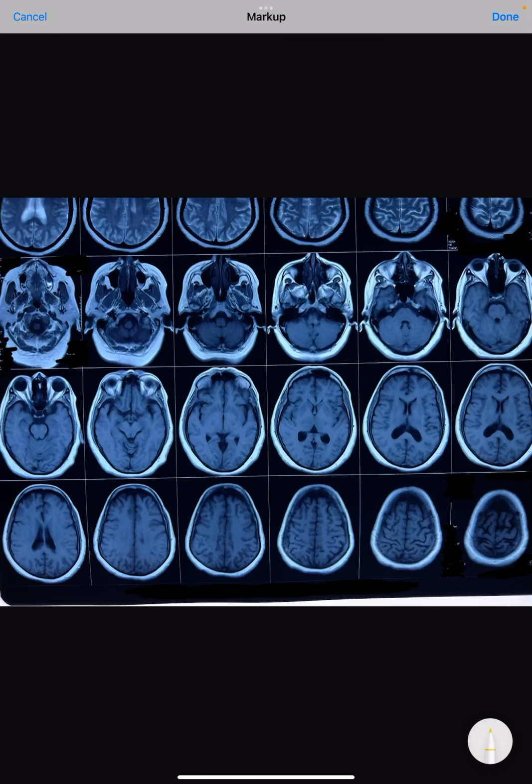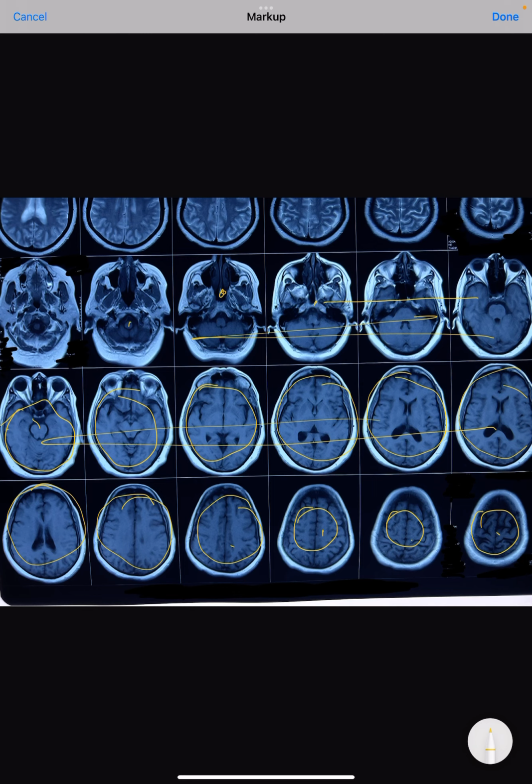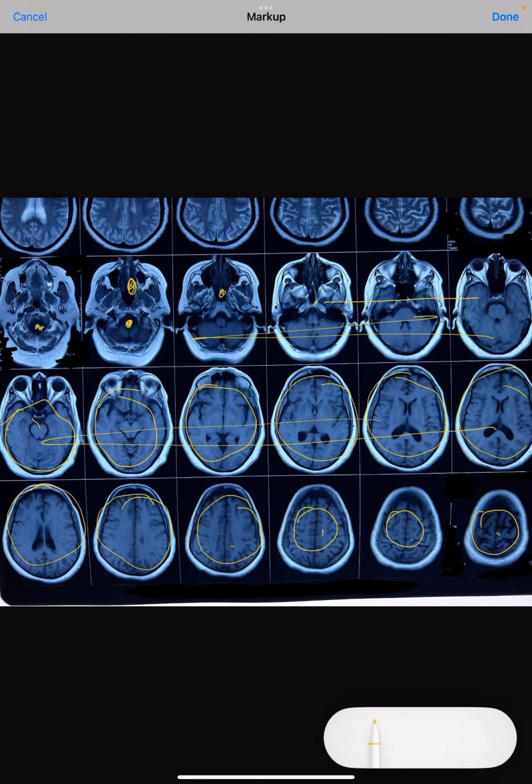So we can see this is the brain, which starts and increases in quantity. So this is the increase in quantity. This is the medial part, and then the brain is again getting reduced in size. So this is the uppermost part of the brain. This is the middle part, and this is the lower part, because from here we can see that this is the nasal part, and this is all the spinal cord which is getting started.